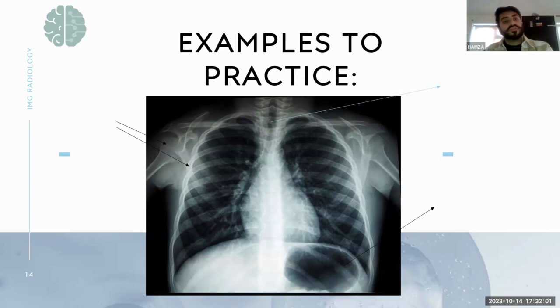So on the left image, which is actually your right in real life, but on the left-hand side of the image, you can see a bone. And you can actually see two examples there, two arrows. So the arrow, sorry, Tiju, can you point towards the humerus, the shoulder, if that's all right? Thank you. So why would we say that that is white at the moment? What's happening here? Why can you see that quite clearly? Because you can see some other whitish stuff around it, but why is that more white than the whitish stuff?